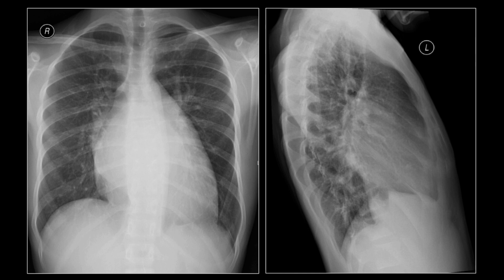And in practice, many radiologists would stop there because the rest of the case could actually be discussed over a good echocardiographic study. However, you could be more precise when looking at such cases, and in an exam setting, the examiner would probably want to hear more. So cardiac enlargement is not enough. You have to decide if you could figure out specific chamber enlargement.